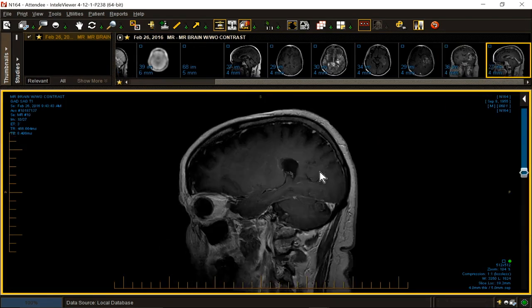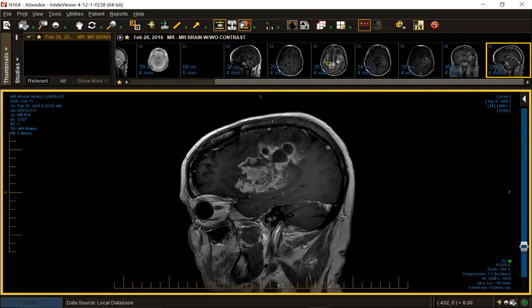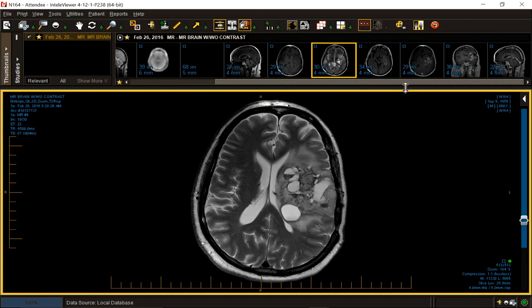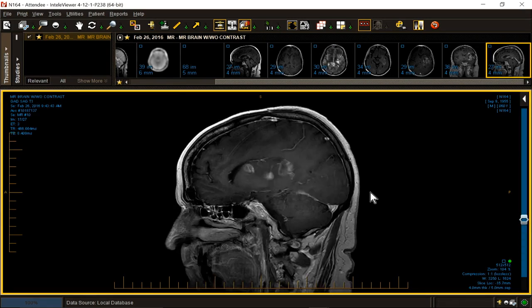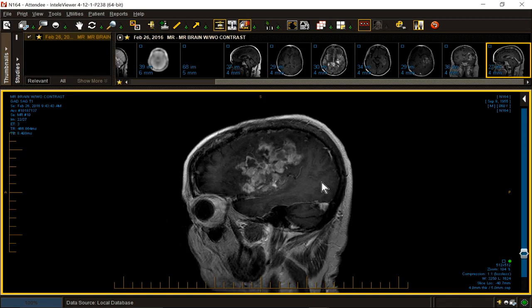Let's look at it sagittally. So it's anterior to the supramarginal gyrus. It's predominantly a deeper lesion. It has some atypicality in that they're usually a little more anterior, usually more frontocentrum. This is more parietofrontal centrum, but that's neither here nor there. So this is a patient whose oligodendroglioma has gone rogue. It has progressed, as opposed to pseudoprogression.